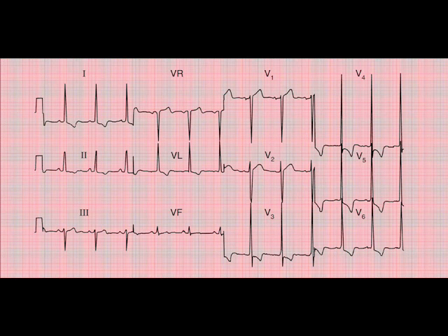Why this is suggestive also of left ventricular hypertrophy is those tall R waves are accompanied by upside down or inverted T waves, which is not uncommon to be associated with the tall R waves in left ventricular hypertrophy. Conversely, look how deep the S waves are in V1. Little R wave to start with, then a deep S wave. So this is suggestive of left ventricular hypertrophy. So it isn't unusual that the cardiac axis is heading towards lead 1 because you're getting an enlargement of the left ventricle. Having said that, that axis could be normal for that patient, but it is interesting that it heads particularly towards lead 1.